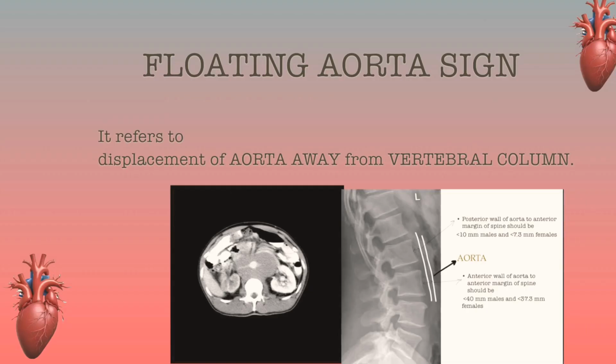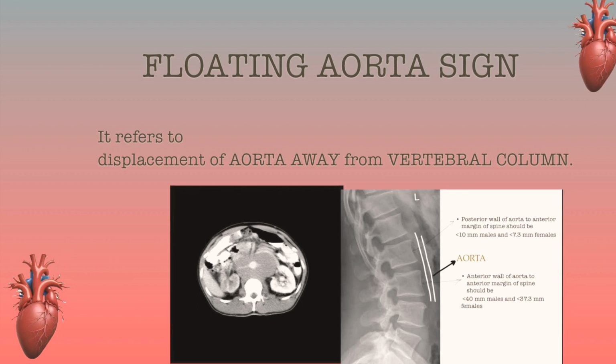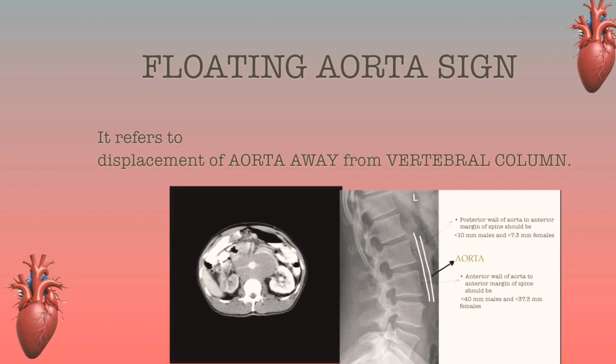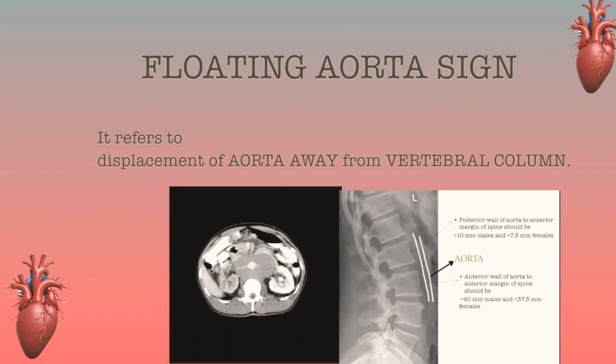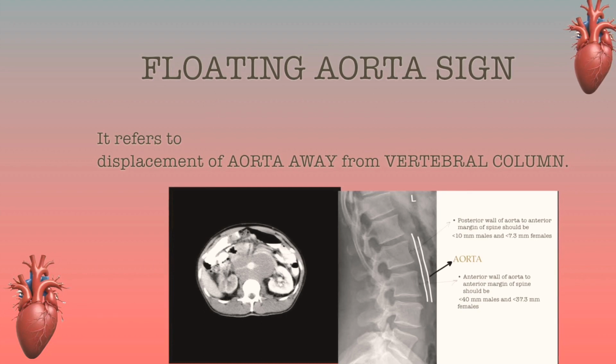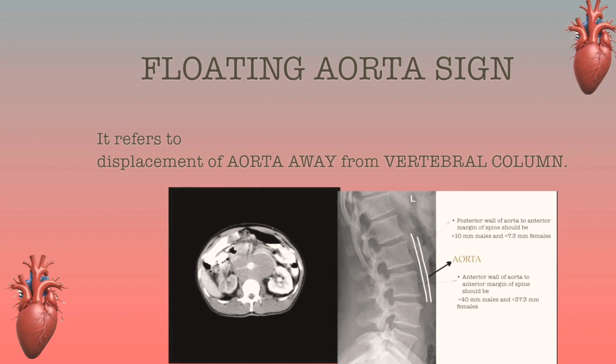This can be asked as an OSCE question, wherein they will give you an image of CT abdomen, and you will see aorta is floating in the soft tissue prevertebral retroperitoneal mass without any significant luminal narrowing. So first step is to diagnose, and then second you have to tell the differentials, amongst which lymphoma should be your first differential. Third, they can ask you, can you suspect this entity on X-ray abdomen?